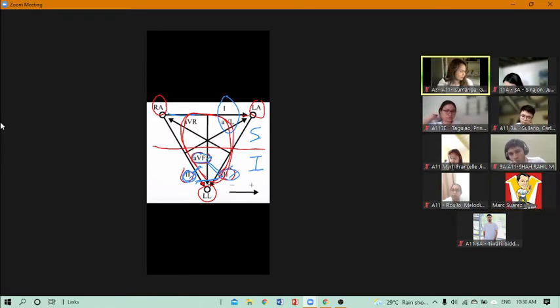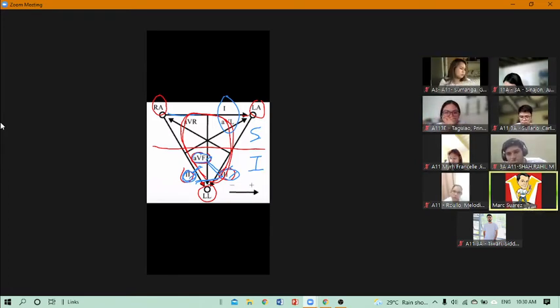Yes, Doc. For it to be significant, the ST segment elevation must be found in a particular pattern. Just in case you see an ECG, it must be seen in lead aVF, in lead 3, and in lead 2 for us to conclude that it involves the inferior wall.